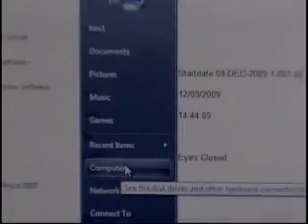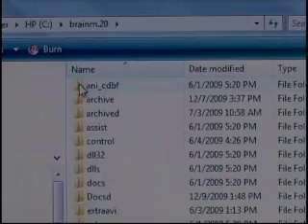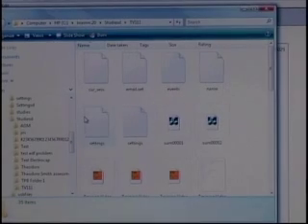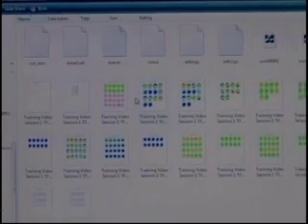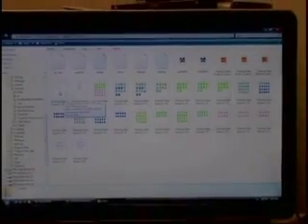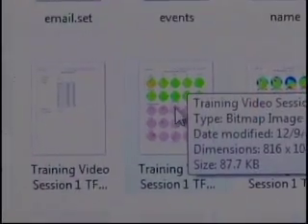And if I want to see those files, I will go to my computer this way: local disk C, BrainM.20, Studies D, TV111, and now I have the bitmapped graphics files right in the directory. Page 1 is the cover page of the report. Page 2 is my technical information. Page 3 is the summary, and that's the one I like to send out.